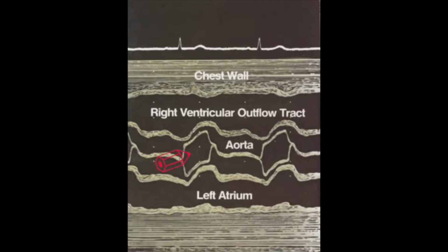Here's a labeled schematic. The open box is the open aortic valve. The closed lines in the middle are the closed valve leaflets. Black space at the top is the RVOT. Black echo-free area at the bottom is the left atrium. Why do I care about this?